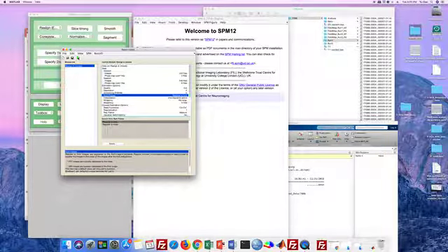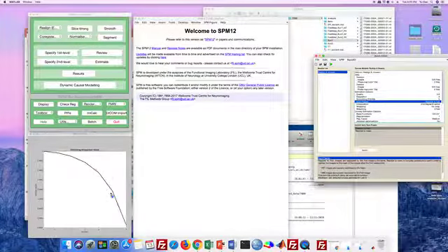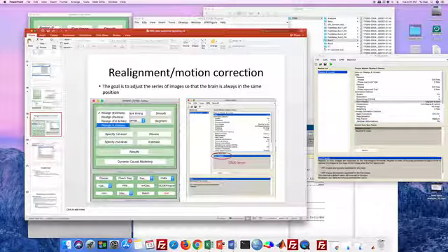Okay, so that's it. We click here, Run Batch. That's easy, right? But it takes several minutes to run. So after you click run batch, something appears here. We can see how many percent we have finished. So the computer is estimating the head movement across time.